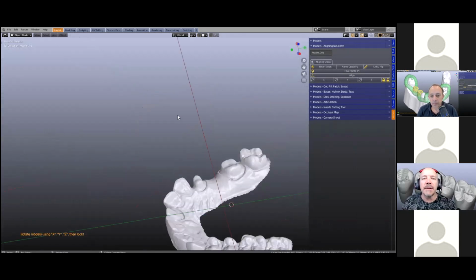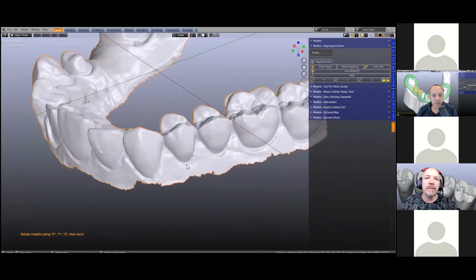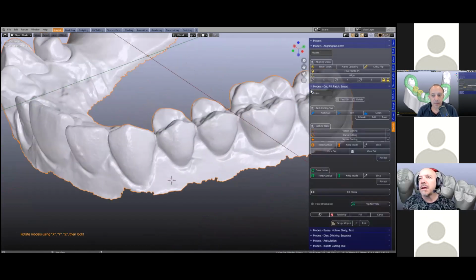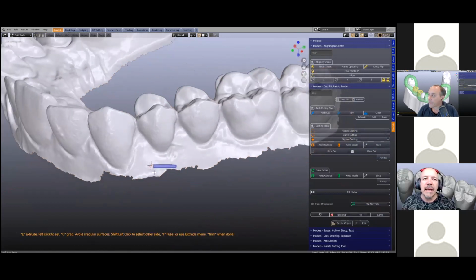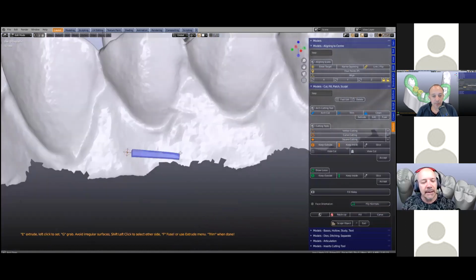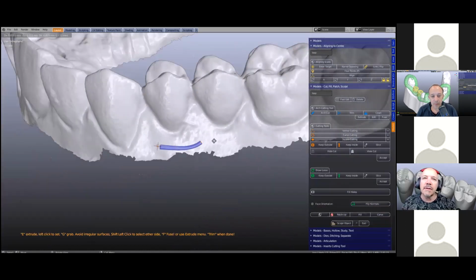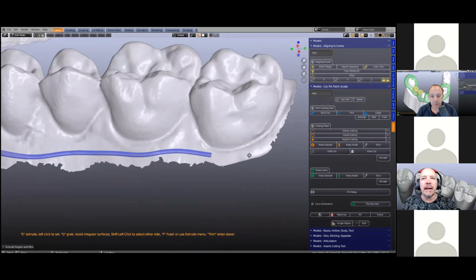Now, sometimes we need to cut these. So I'm going to select it, shift right click to place my cursor, and we're going to click Arch Cut Tool. And this will extend, there's two vertices on the scene. One of them has been extended outwards. So here I'm using E left click. And this is what I'm used to: E left click, E left click, E left click.